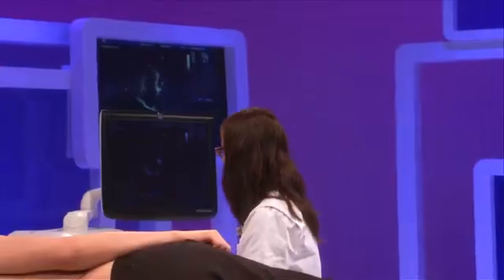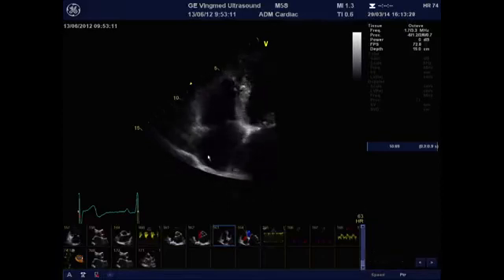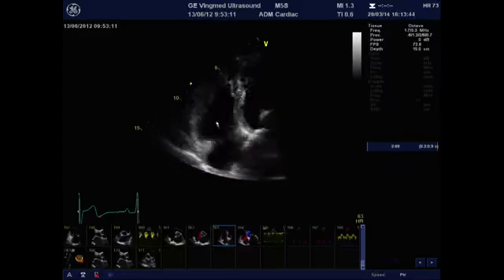And lastly, what you can do is just take a look at the right ventricle, because the presence of a significant mitral stenosis has repercussions on the left atrium size and on the pulmonary artery pressure, and also on the right atrium and the right ventricle, which are facing overloading pressure, and thus they become dilated, and also regarding the right ventricle hypertrophic, and at the end stages they can become dysfunctional.